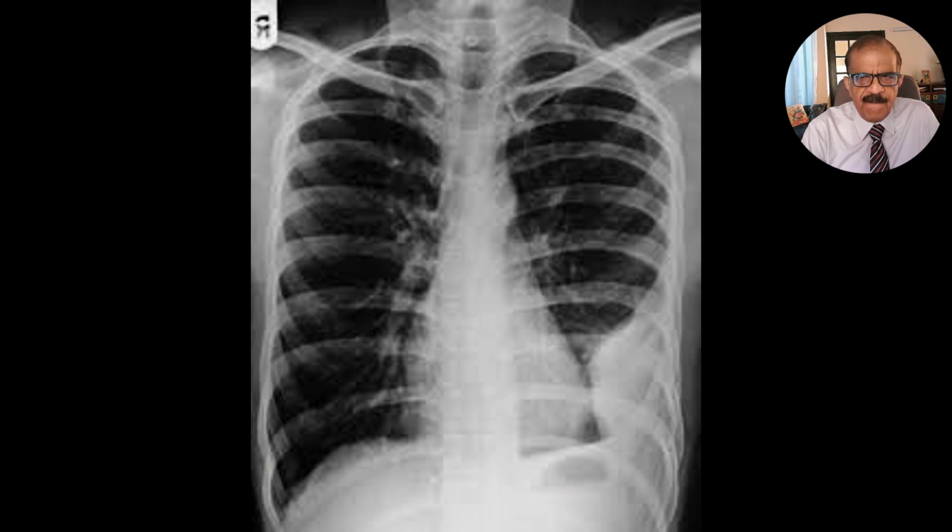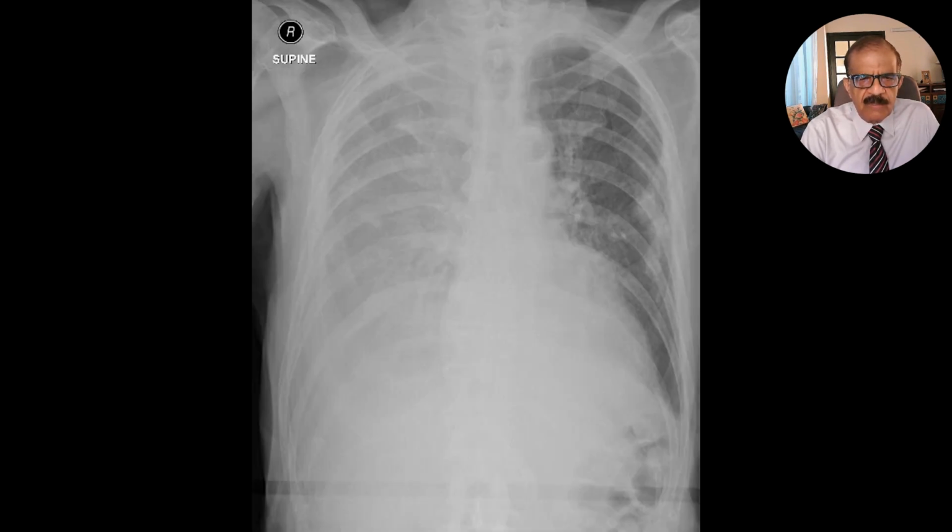This side is clear. What do you see? Is this pleural effusion? If it is, is it so big that it has taken up the whole hemithorax? And if that is true, do you think there is a proportionate shift of midline structures? They actually appear almost normal. The heart may be slightly shifted, but not much. Trachea is normal. So what is this?